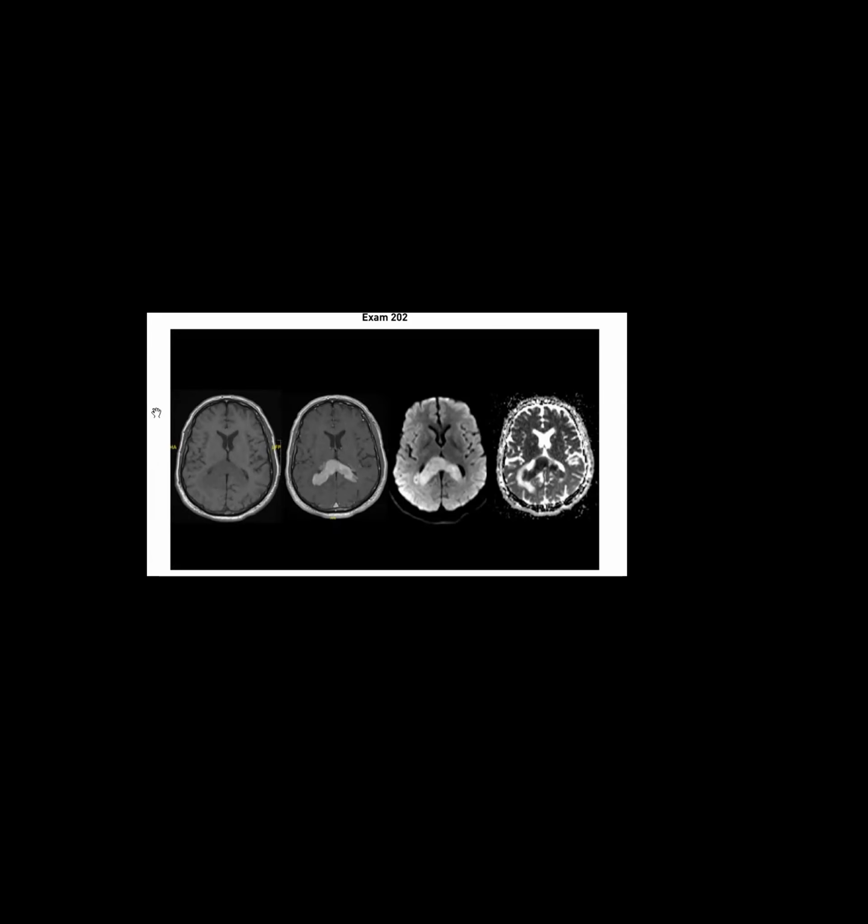Let's see. Sadaf, can you hear me? Yes. Okay. So take a look at this case and tell me what you see on here. What's abnormal? So it seems like some, I'm sorry, I need to mute it.